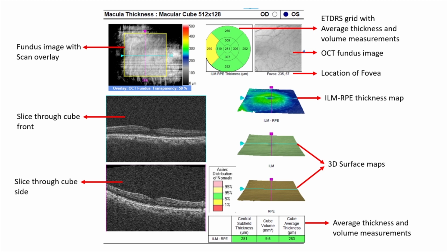Okay. And on this scan, you see this. This is clearer than this scan because this is the horizontal one. You see that? These are 512 scans going through here. It is vertical and only 128. So there's a logic. These all have no units. That means they're just plain numbers. They are just location maps.